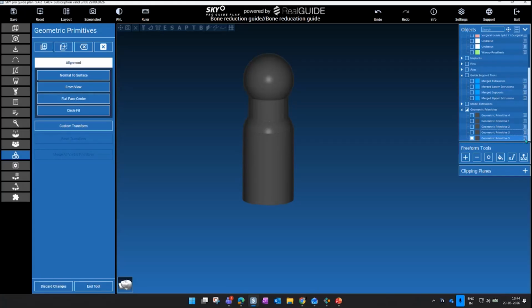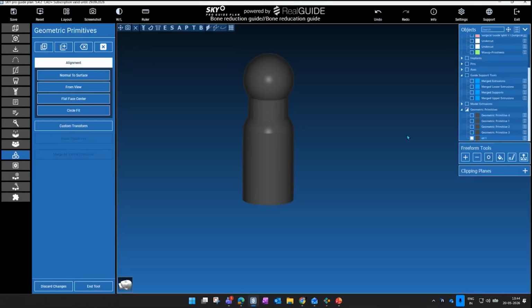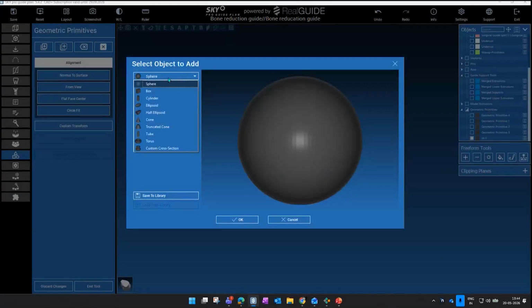So we can go here and rename it as STL1 file what I generated. Okay, so this is our merged part. I'll create one more part which will be separate from this and I'll be using it in the next, as I said, processing stage. So click here.